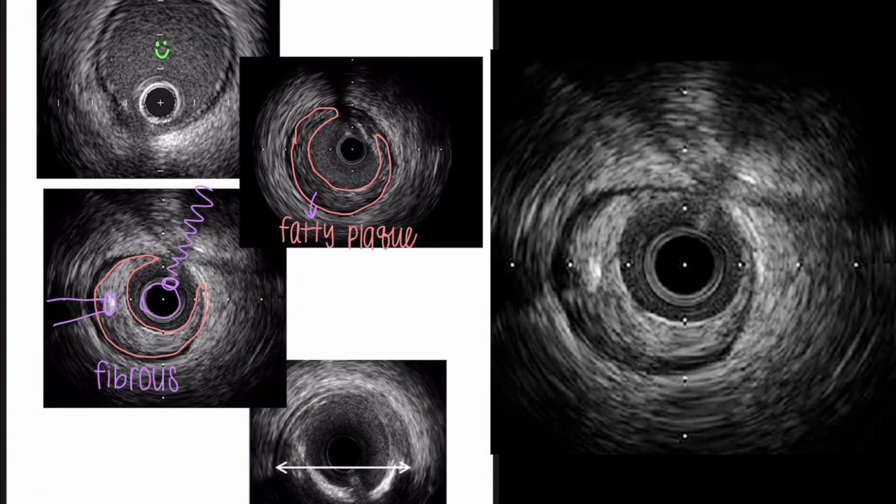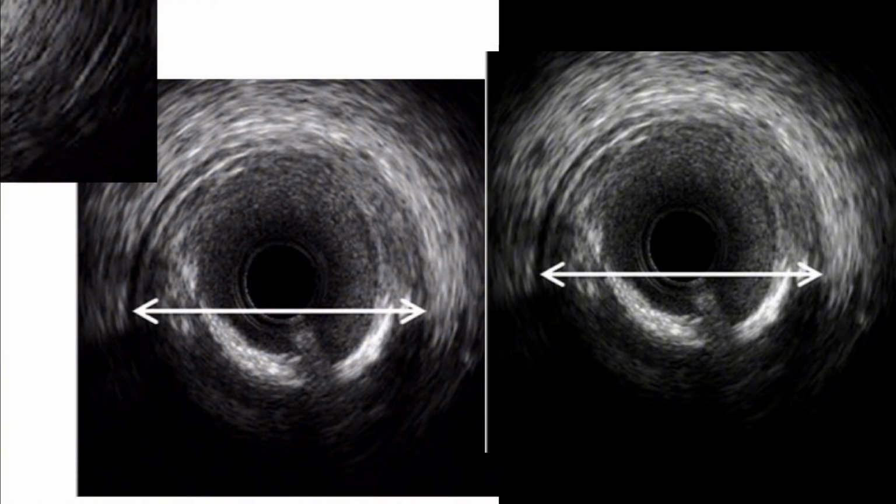Now let's look at the most dense, which would be calcium. But again, I'll keep saying it, we're not going to skip steps. So you see this is the catheter. The next black after it, all of this would be the lumen. Okay, so I'll outline the lumen a little bit there for you. All right, so then where it turns white, which you can see right here, that is the intima, right? Which, yes, the intima kind of lines the lumen.